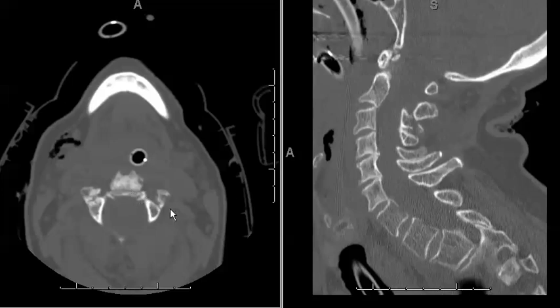well. A CTA should definitely be performed in this case to rule out dissection of the vertebral arteries, as the vertebral arteries course through the foramen transversarium from C2 to C6, which involves our level in this case as well.